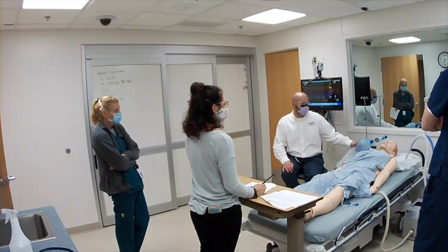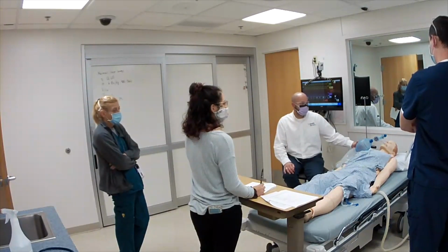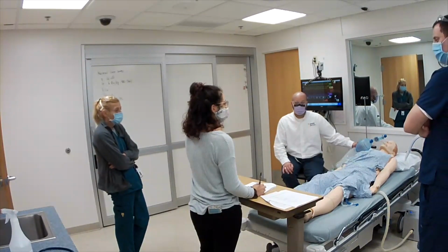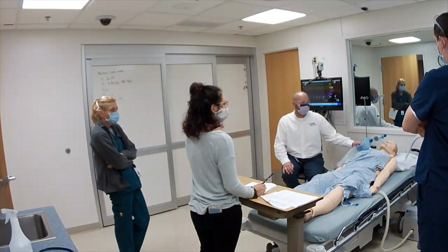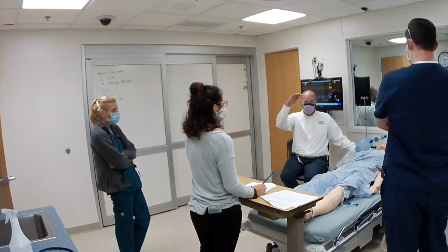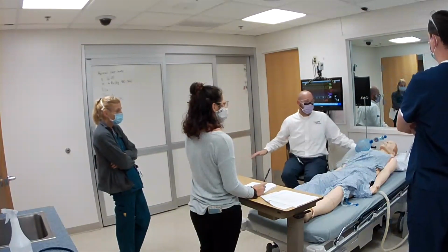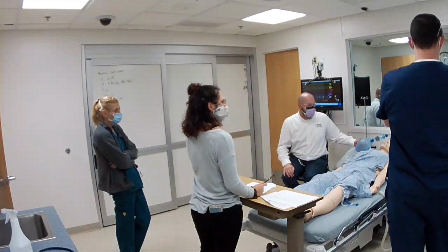Your sensitivity to them taking a breath. So what do we usually set trigger flow? Something to make it easy enough to overcome the tube, to where if they do start breathing, it doesn't stack breaths.